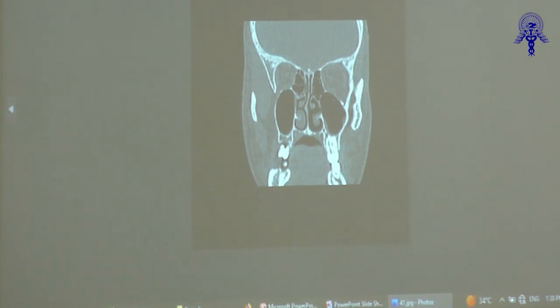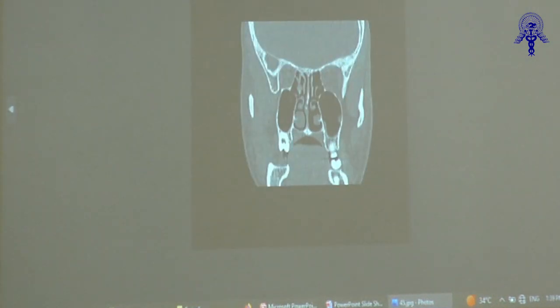In addition, not only the sinuses, we also look at the turbinates, because as we look at the sinus scan, we also need to keep an eye on the posterior part of the nasal cavity. There may be a tumor here in the posterior part of the nasal cavity, which you will miss if you are just focusing on the sinuses. So you need to see the character of the turbinate, and we know there is a smooth transition of this hypertrophic turbinate versus a normal turbinate on this inferior turbinate. And as we keep going, we will also see the bone here, the orbital lamina, which is intact. Of course, this is a normal scan, there is no disease here.